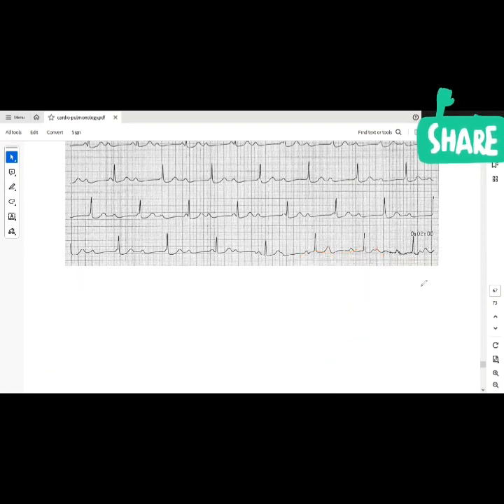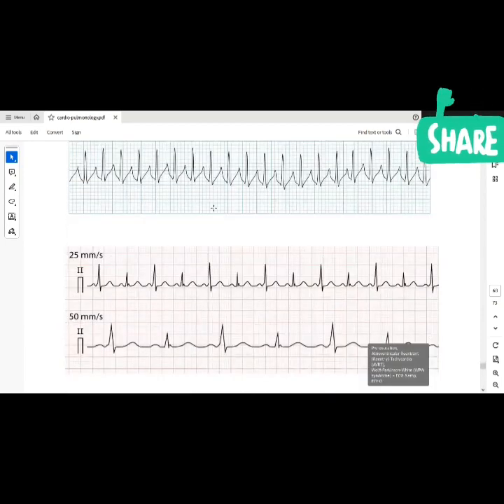Now let me show you the ECG for Wolff-Parkinson-White. Like you mentioned the delta wave, let me show you that now. And you're right, we can basically predict what we expect to see. For this ECG, actually the one at the bottom, this is the P wave. Do we have a PR segment here? We don't. Immediately after the P wave, you see the QRS complex going up, which tells me the action potential is not going through the AV node. That's why I don't have that PR segment. It's bypassing the AV node and going through another accessory pathway. So you're going to see a decreased or absent PR segment in these people.